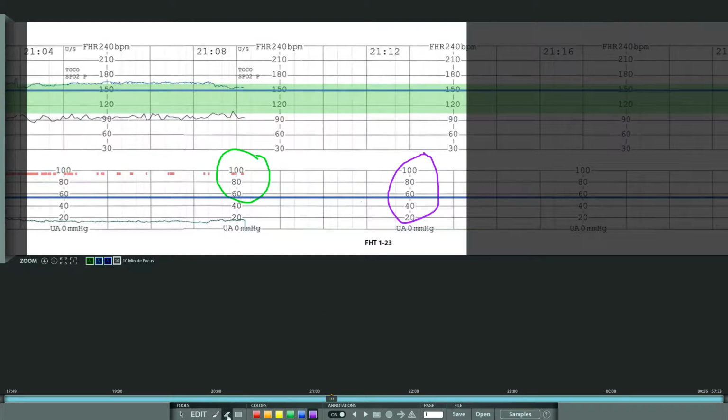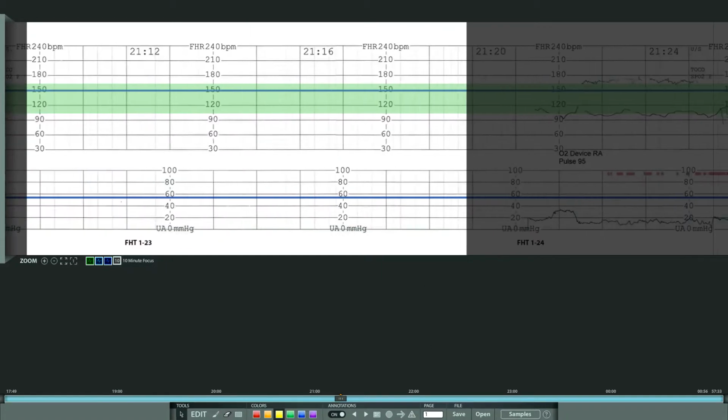Next button I have over here to the right of that is the erase button. To the right of that is a kind of a highlight square button. So if I wanted to focus on just this part as a purple and this part being yellow, I can do so. And again, if I go over to the tools button for the eraser, all I have to do is just click on them in order for them to go away. With the circles and the drawing, you have to be pretty precise of where you're clicking on for it to go away though. And if I wanted to go back into moving this thing around, I would need to go back to the mouse tool in order to give you that functionality again.